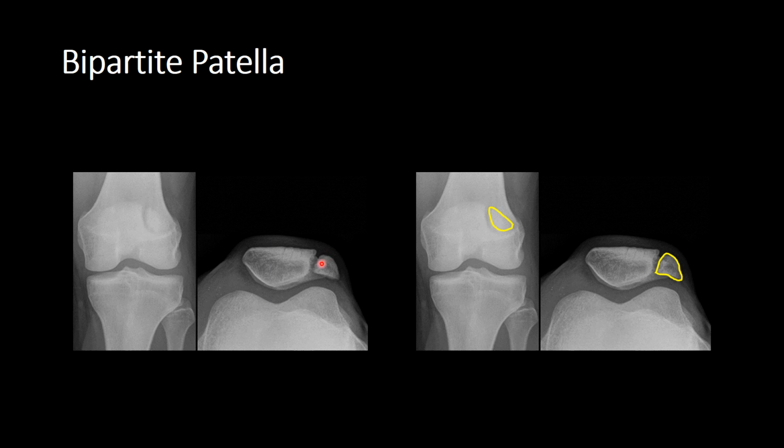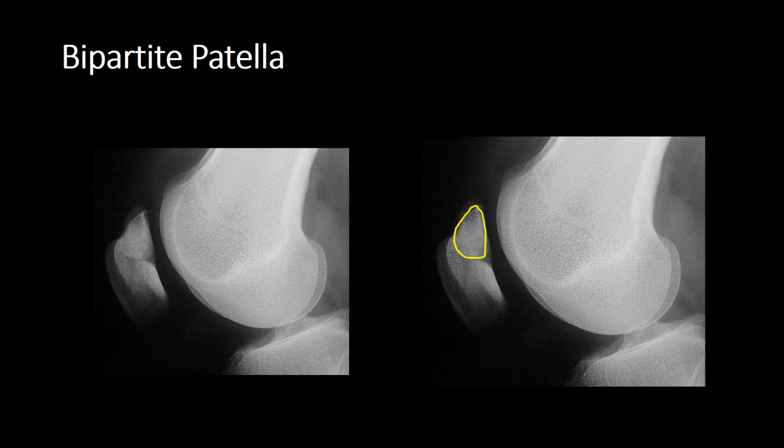It doesn't actually directly fit into the adjacent host bone, which again indicates a chronic appearance, because if you have a fracture, invariably that will directly fit into wherever it's been torn off. Okay, let's have a look at it now from the lateral perspective. And now on the lateral view, if we look carefully, you can see the increase in osseous density in the superolateral margin. And again, this has very non-acute features, so it shouldn't be mistaken for a fracture.